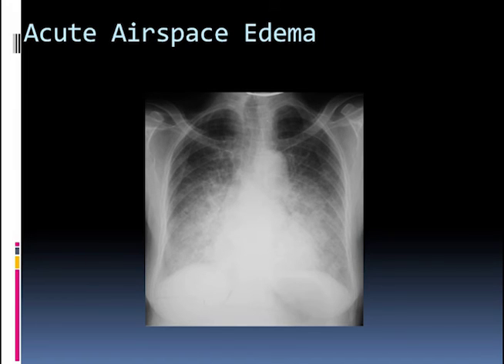It usually happens when people have a really bad, severe acute cardiac problem. And we don't really see this pattern too much. So we've got bilateral airspace consolidation. If you look closely, you can see an air bronchogram going into the lower lobes. But we have symmetrical changes, and they're gravity dependent.